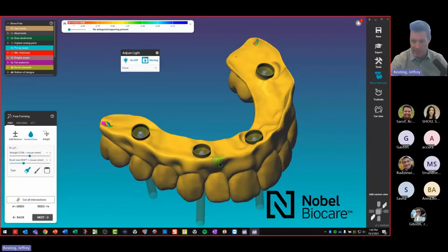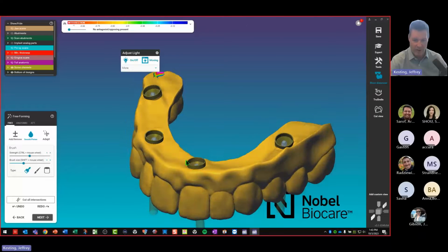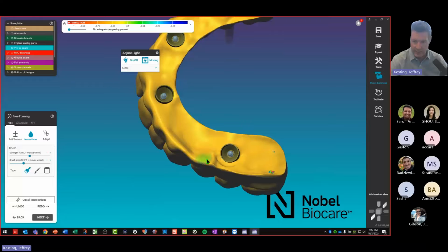And I'm going to keep my abutments on there because I obviously don't want to violate that, because if you go through there, you could violate minimum constraints. You'll see that in our software, it won't let you send that through if you violate that. If you're doing provisional bridges, you could do that, but a good idea is to just keep those abutments on.